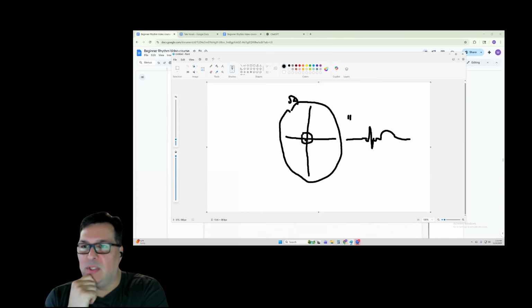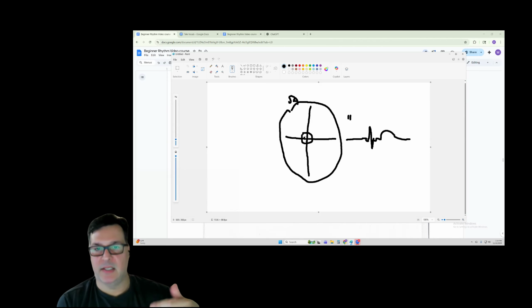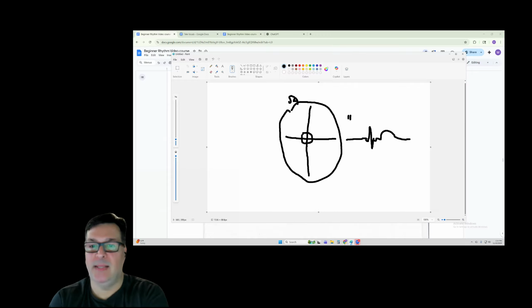So you can have what's called a retrograde P wave. Go ahead. Sorry. Oh, no, I was saying that makes sense. It's called retrograde, and that's if the impulse is coming from the area of the ventricles. It's lower. It's not purely coming from the ventricles yet, but it's lower in the junctional areas, the upper part of the ventricle. But it's still going to be a narrow QRS complex because it still goes down that normal flow of the septum down to the bundle of His through the Purkinje fibers like it normally would.